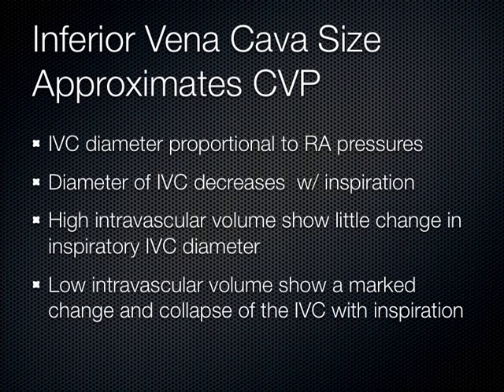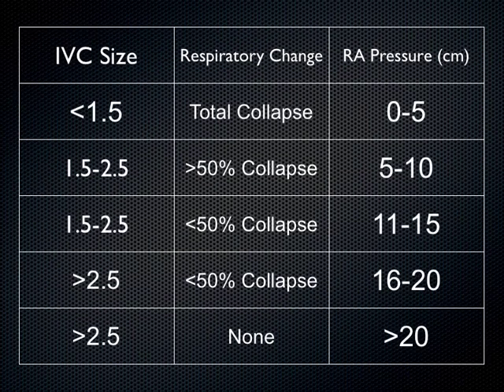You give the patient more fluids or less fluids based on the CVP. And that's especially true when you have patients who are in shock, like septic shock. And so that's where this all will play in for you later in your clinical years. But I just want to give you that preamble right now, that you can actually estimate the right atrial pressure non-invasively by looking at the diameter of the IVC and how it collapses during inspiration.